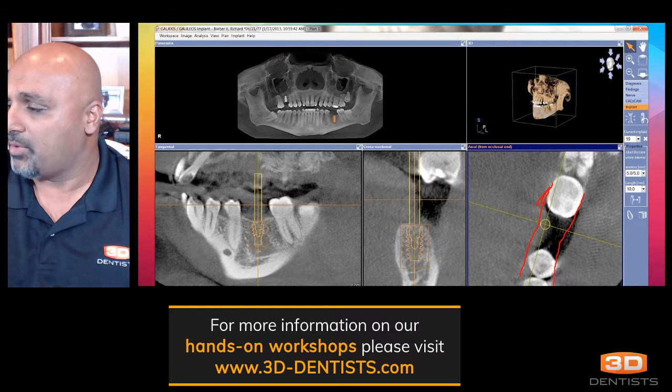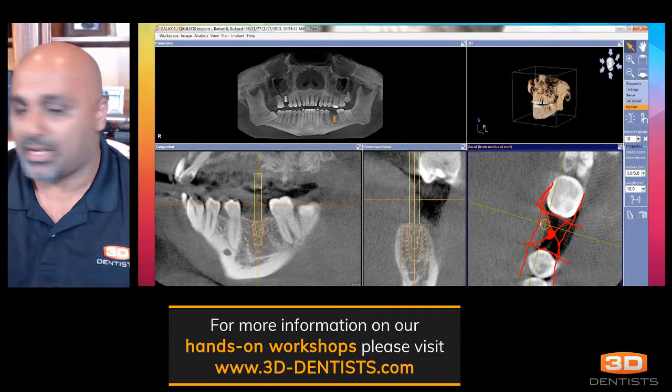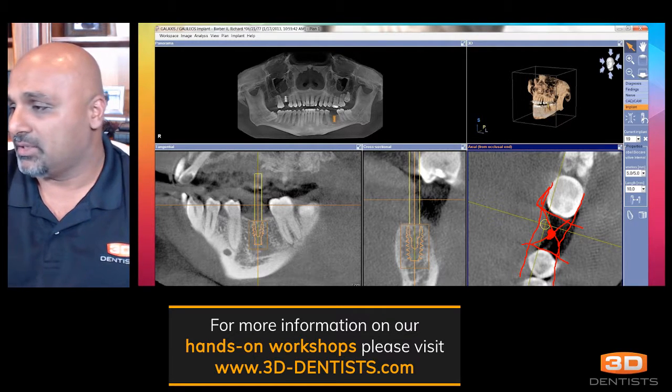I will draw a bounding box on my buccal, on my contact here, my contact here, and ultimately what I'm looking for is to get my implant dead center within this rectangular box. And this is kind of what that's going to look like here.